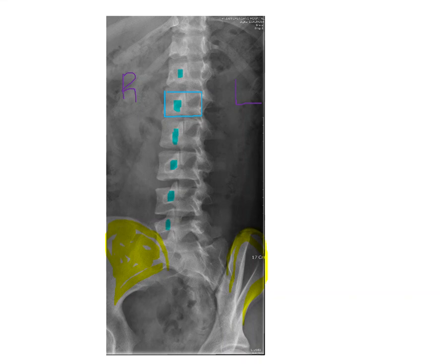If we say the pedicle is projected more anteriorly on the body, like in this area here, then that would mean that the patient is under rotated. If the pedicle is projected more anteriorly, it means that the patient is under rotated, meaning that we did not rotate them a full 45 degrees.